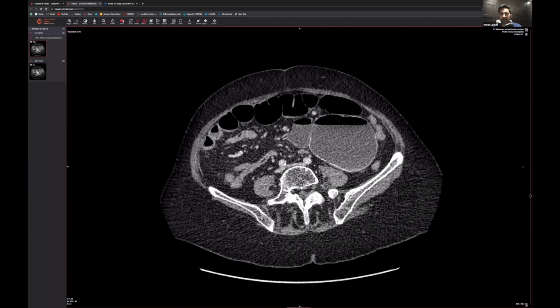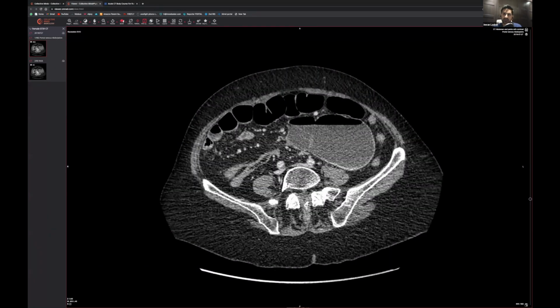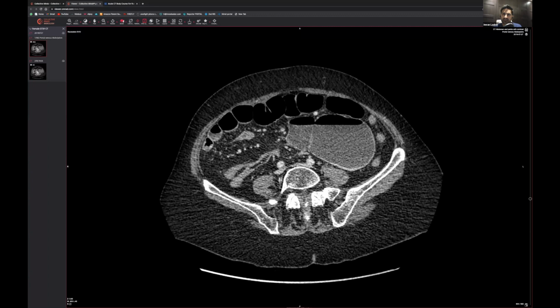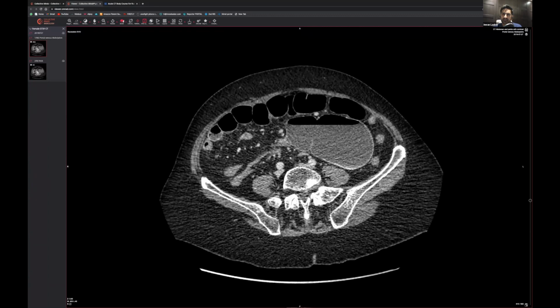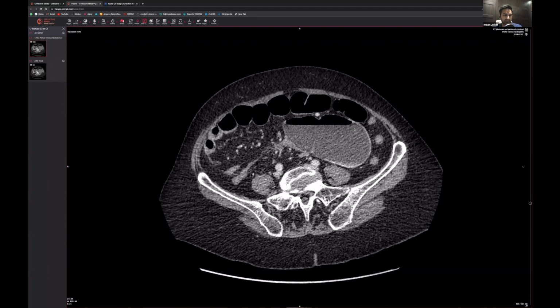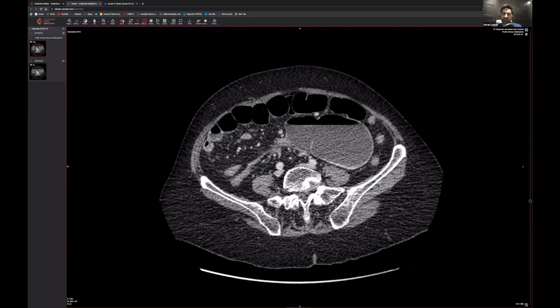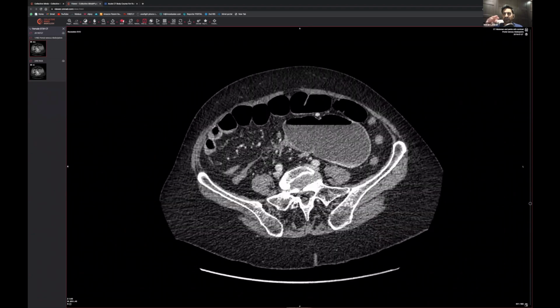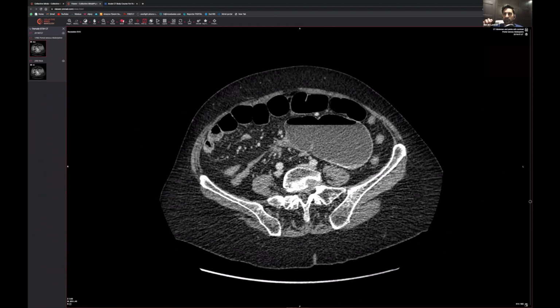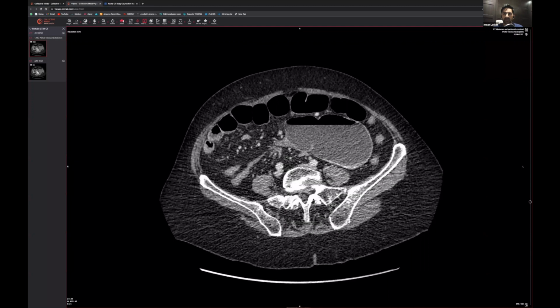And look, can you see that? Can everyone see that? So we followed that descending colon that way. You've got a bit of what looks like fat density there. And then you kind of seem to sort of go into this area here. And then it becomes really dilated. Can you see that? Can I convince people of that to be true? So generally speaking, I would say that if you've got fat within the ascending colon in such a focal way, you're probably looking at the terminal ileum somewhere there.